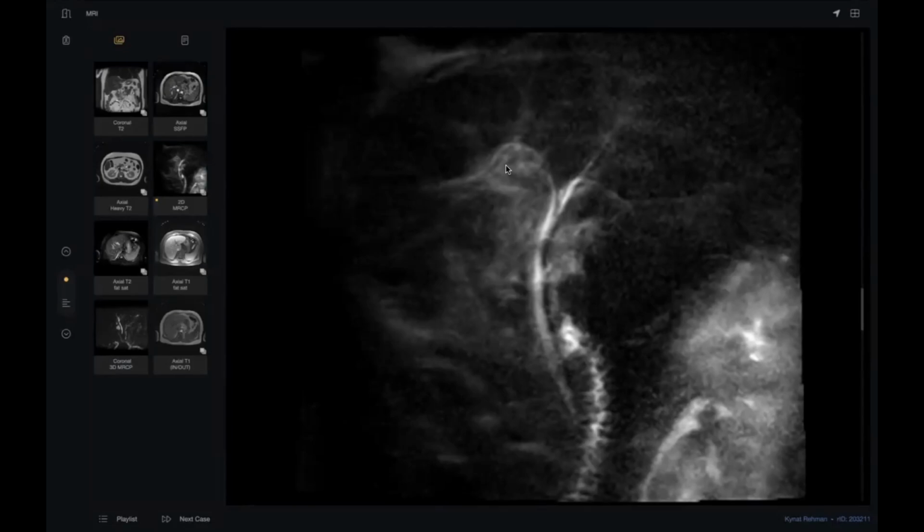What is the name of the process of enhancement of cholangiocarcinoma? One word. Sorry, cholangiocarcinoma. Sir, it's centripetal. No. What else? Not centripetal at all. Again, you are talking about hemangioma. Sir, I have read that cholangiocarcinomas also have centripetal enhancement.